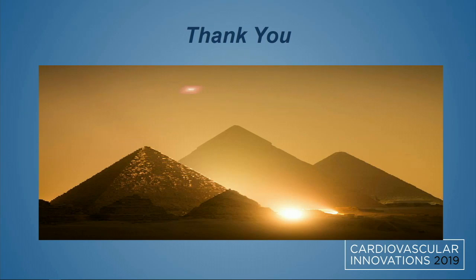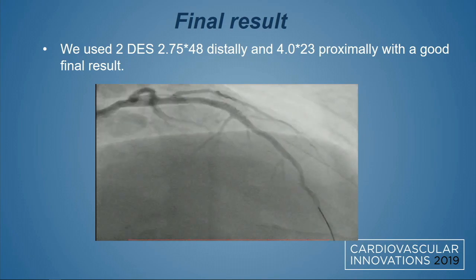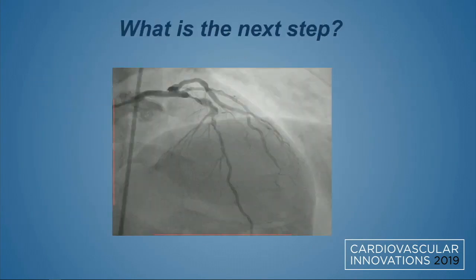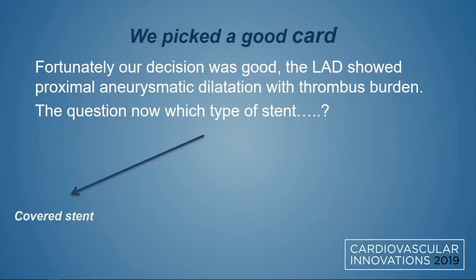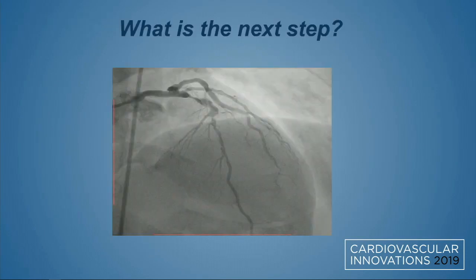Can you go back and show us again the picture after you dilated it? Go back. And did they have troponin? Was it troponin positive? Yeah, positive, non-STEMI. Okay, go back one more. Is that the picture you want, from the movie? Yeah.